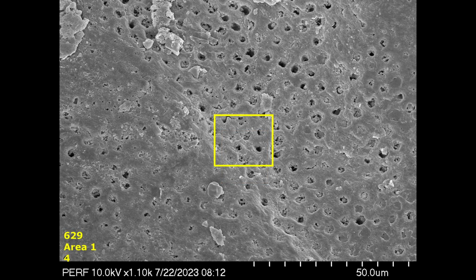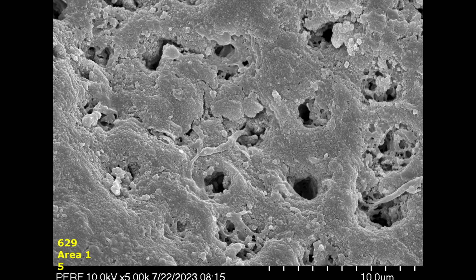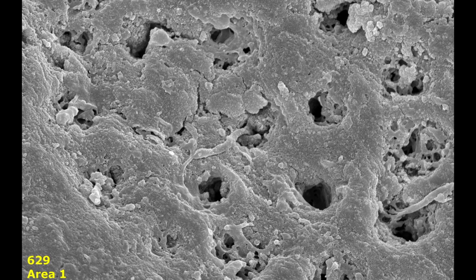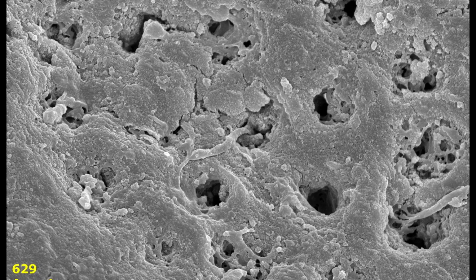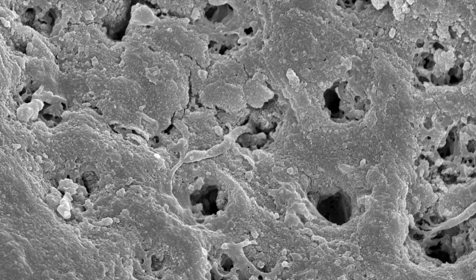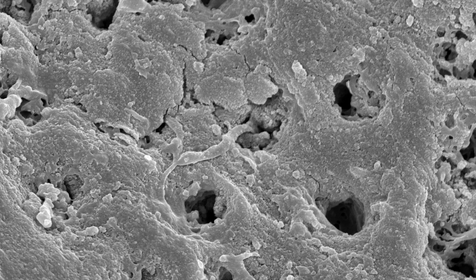A closer examination of the tubules reveals that the precipitation of the non-collagenous proteins of the peritubular dentin suggests that the peritubular dentin is partially intact, as none of the collagenous nature of the tubule is evident, as it is with greater demineralization of the tubule. The extraction of the proteoglycan and glycosaminoglycans of the peritubular dentin by the dehydration and processing procedures produces a fairly typical picture of the mineralization front.